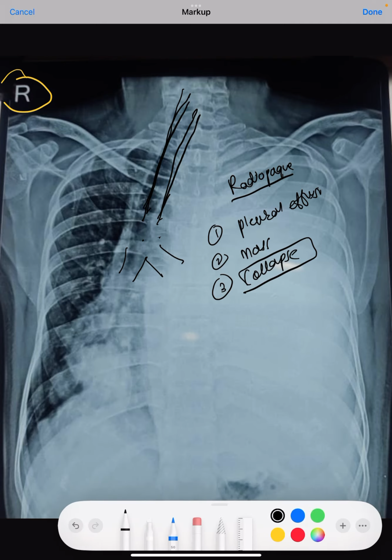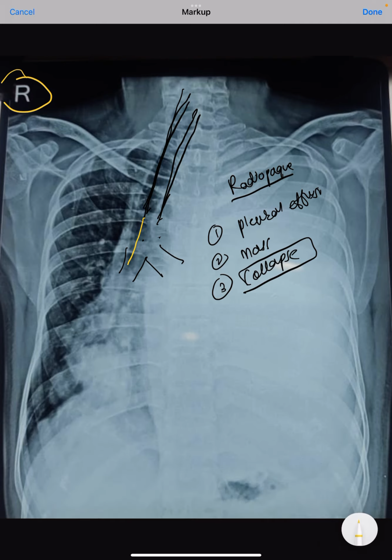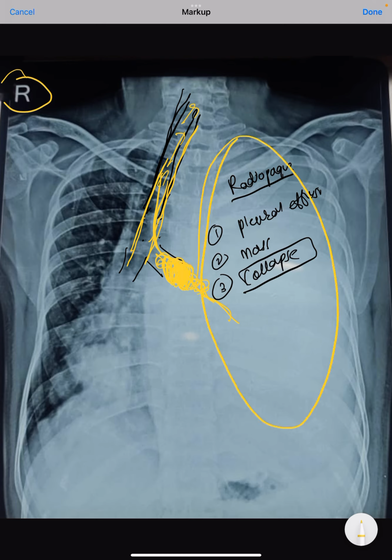If by any mistake the tube is put below that, then this left bronchus will be completely blocked, so the mucus and secretions will not be suctioned out through the suction machine. All the mucus will be secreted here only, and it will block the complete left main bronchus and the lung can go completely white, which is called lung collapse.